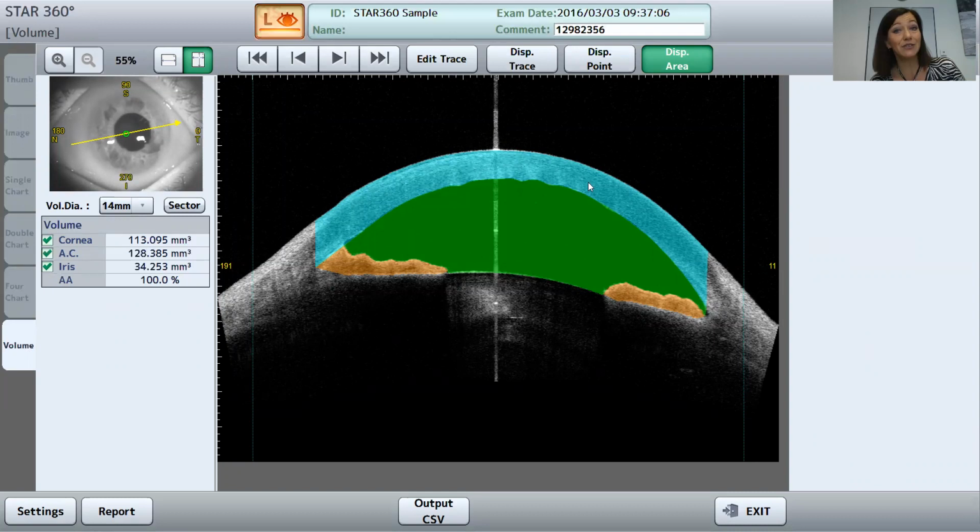I hope you like it. We like it a lot. I know that many doctors appreciate the software a lot, since it is really, really easy to use. With one measurement, you can do it, as long as you use a global measurement where we have enough information about the entire eye.